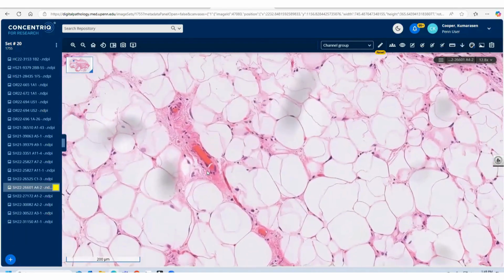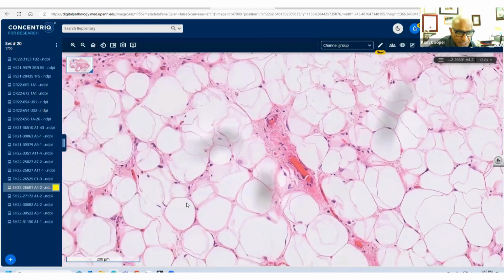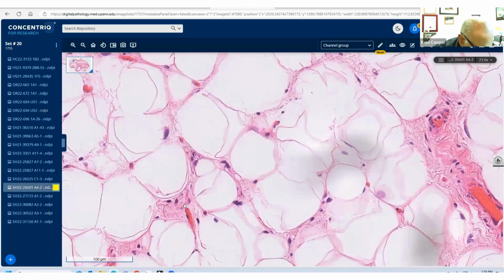Yes, thank you, Prof. Okay, any other questions related to that? Yeah, you can see the atypia here, so that immediately tells you this is not spindle cell lipoma. Now, life is always not that easy, is it, Florence?